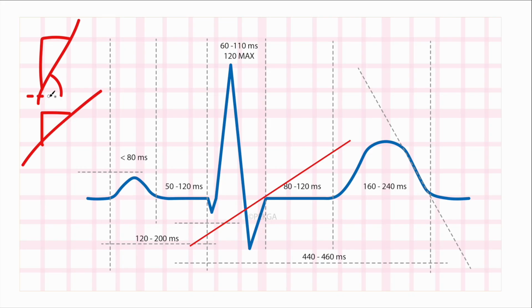If this was your baseline here, you have a very sharp angle. Here, the angle is not as sharp. This is roughly 45 degrees. This is maybe 60. If you have maybe not a great slope, you have a small rise over a longer run. So the angle here is even smaller. Very aggressive, sharp slope, very dull slope.